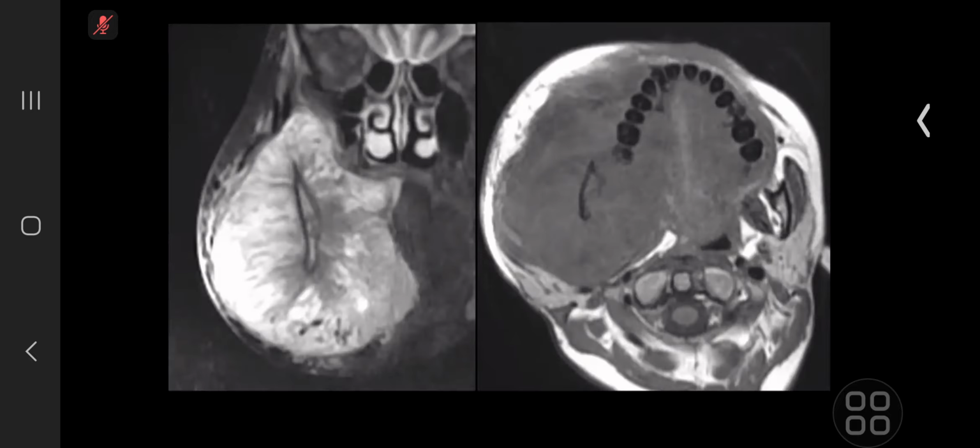That's the MR also. What do you see in MR? I'm just trying to work out, are these post-contrast images on the left? Yes, post-contrast, and then the pre-contrast T1 weighted axial images on the right.